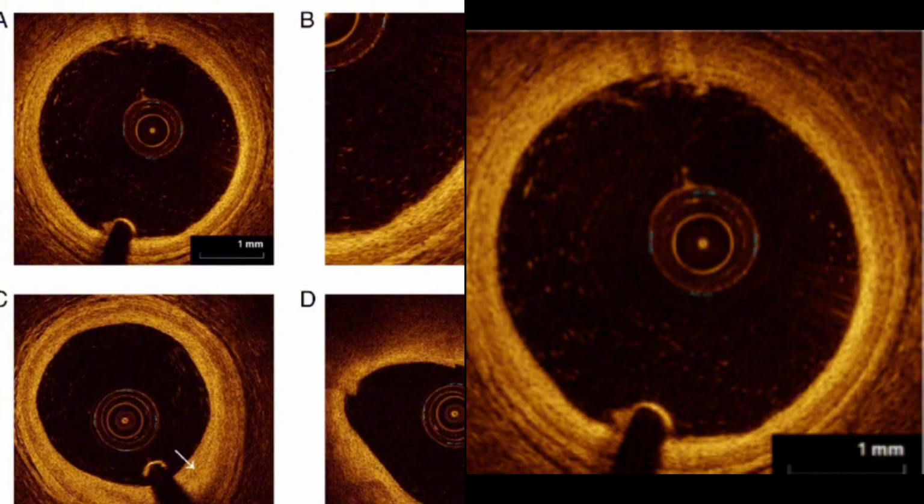But we won't go that fast. So in the center, or really the concentric circle, should be the catheter, in this case the OCT catheter. And then there's a wire. What you notice about this wire is it's not always super close to the lens. Sometimes it's out here, but it's way more distinct. It's going to look like what we call a comet.